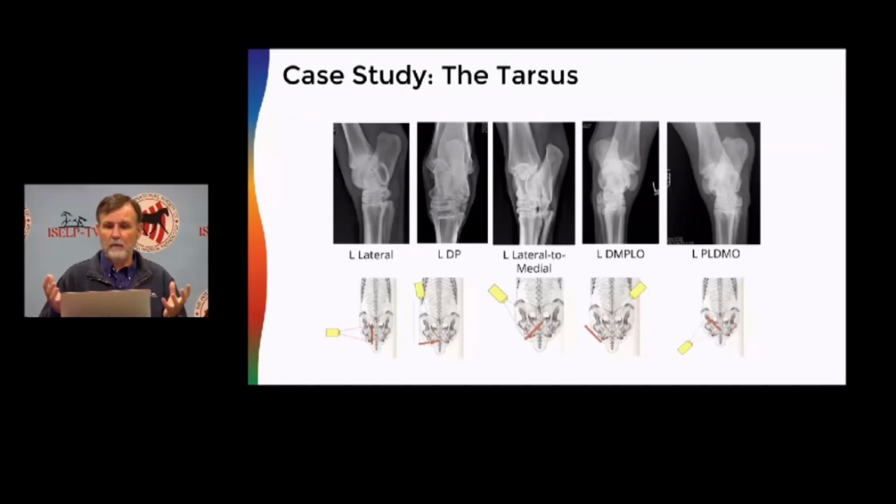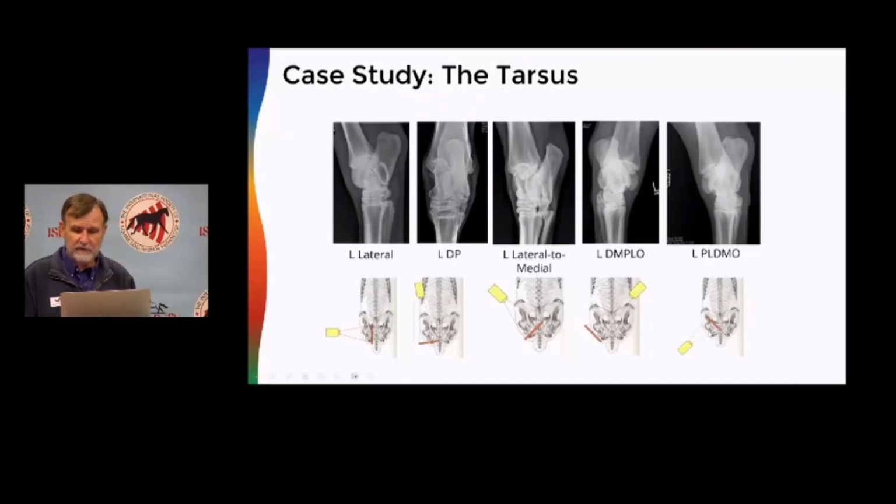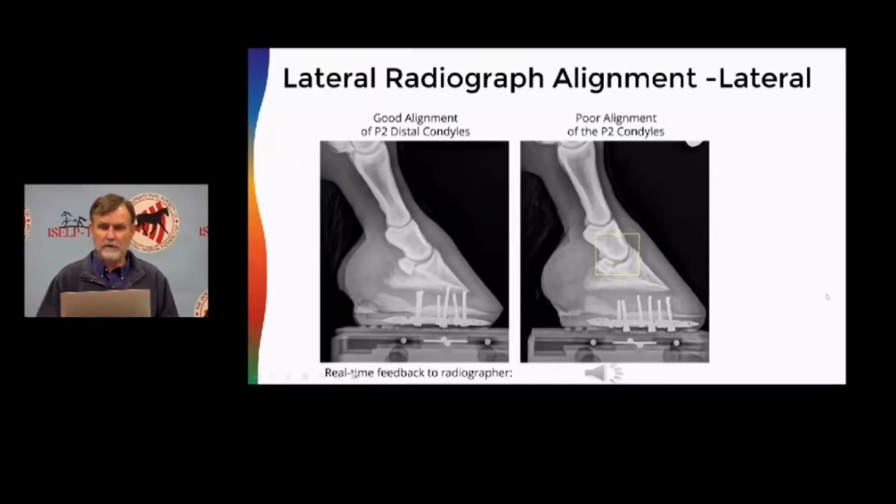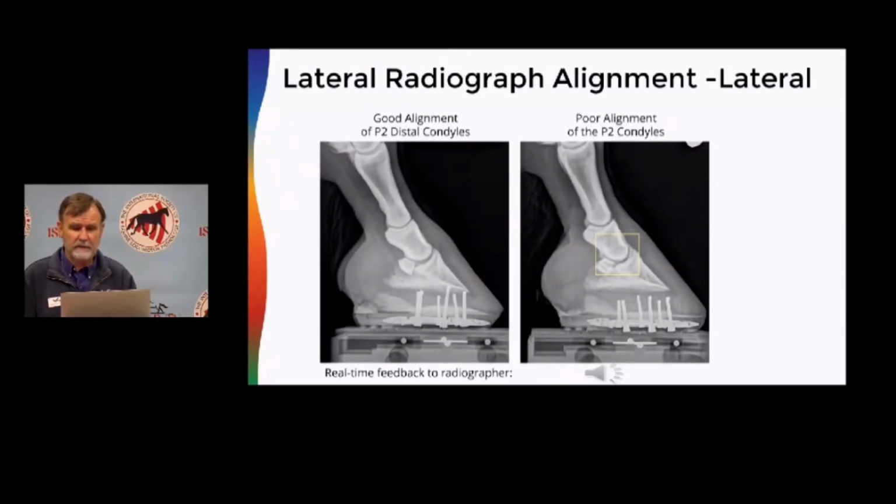And again, we wonder, what's the difference? Well, in this case, we think it's magnification. If you see the calcaneus, the distance between the calcaneus and the detector is about 5 inches here, or 12 centimeters. Here, it's almost touching. So there's going to be more magnification in this image. And then if we look at the 2 radiographs, you see the calcaneus looks larger here. So we're thinking that basically the software is detecting the magnification in the calcaneus on this view, where it's not on this particular view.